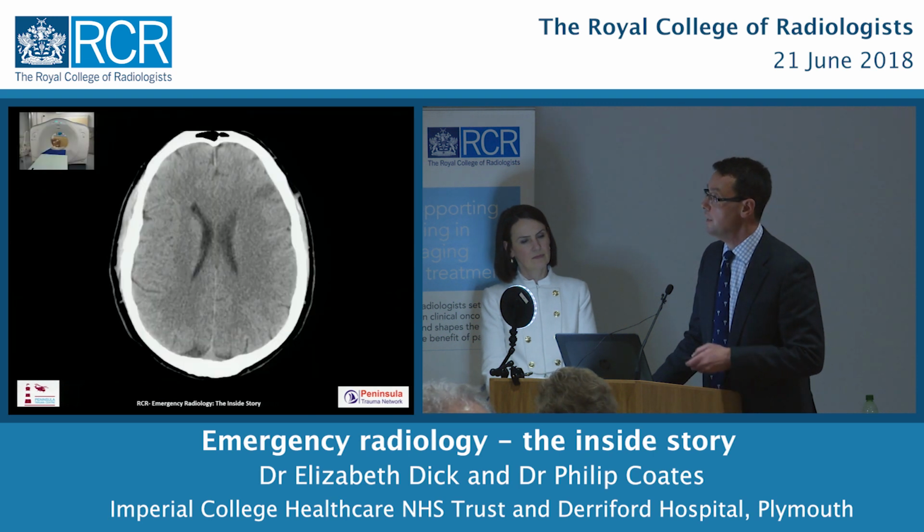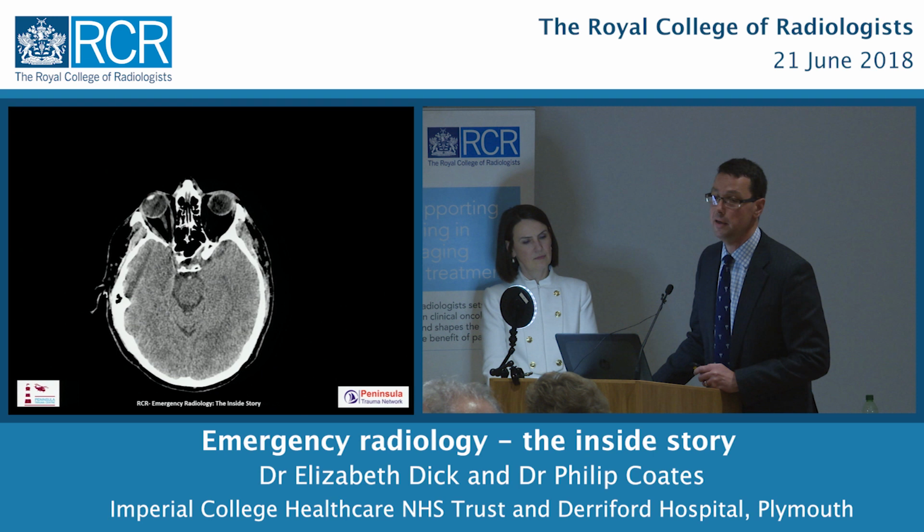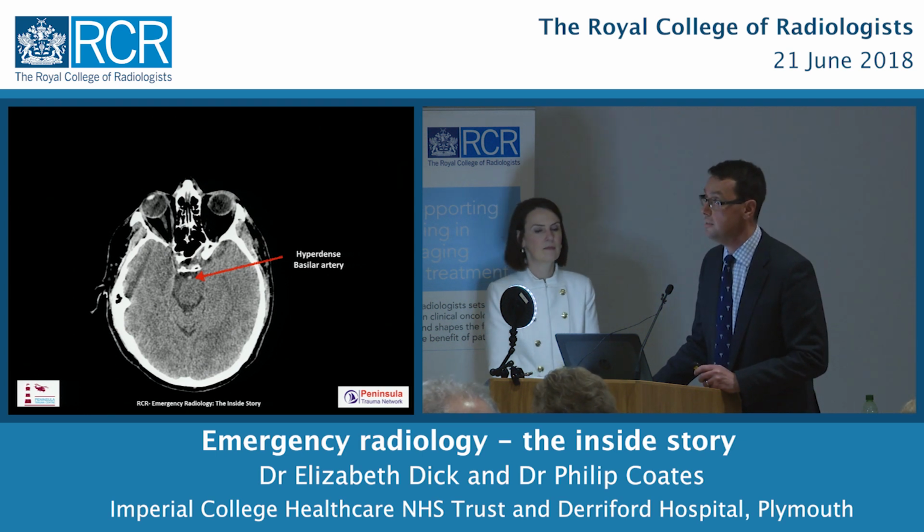And this is the CT scan that he has. Now, this is revealing a dark area just there, which is an old stroke. That's not terribly exciting, but a sharp-eyed radiologist spots something else on this scan, which isn't quite right. Down here is the basilar artery, which supplies the lower parts of the brain and the brain stem. That's denser than it should be.